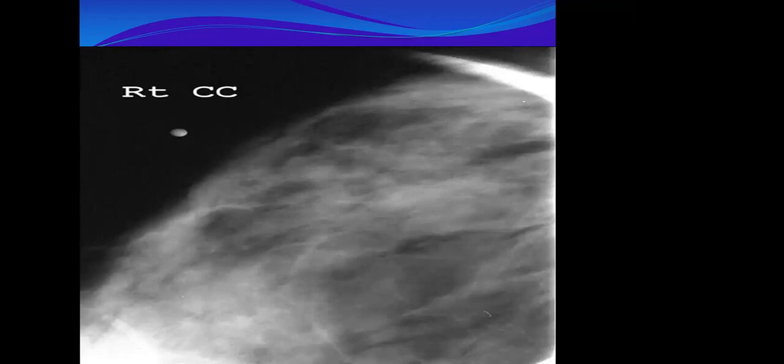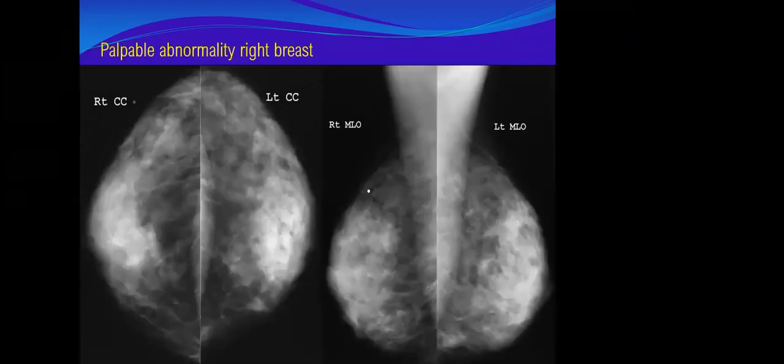No, there is spread of normal breast tissue. But the breast itself is extremely dense and nodular, so expect underlying fibrocystic changes in this type of breast.